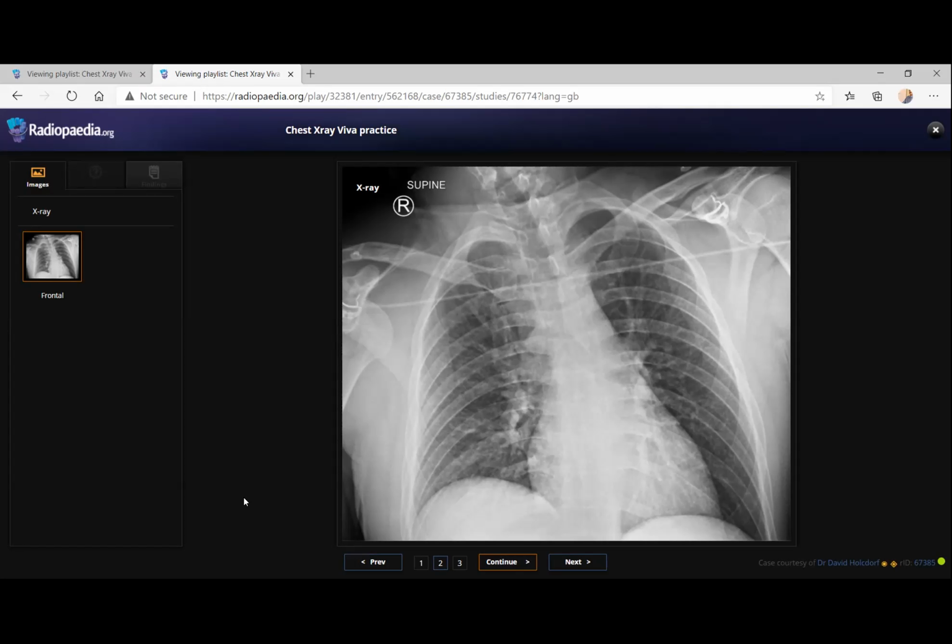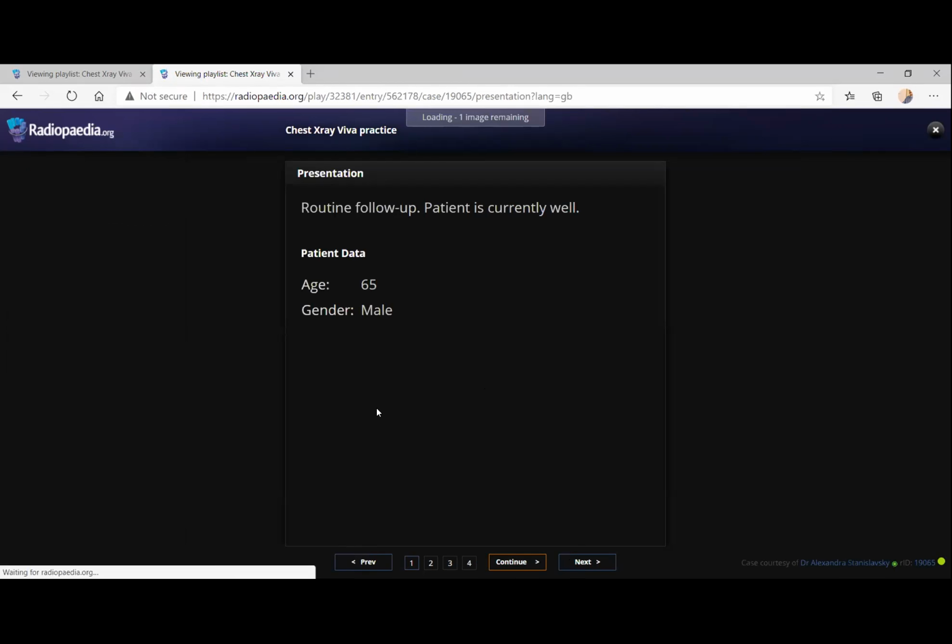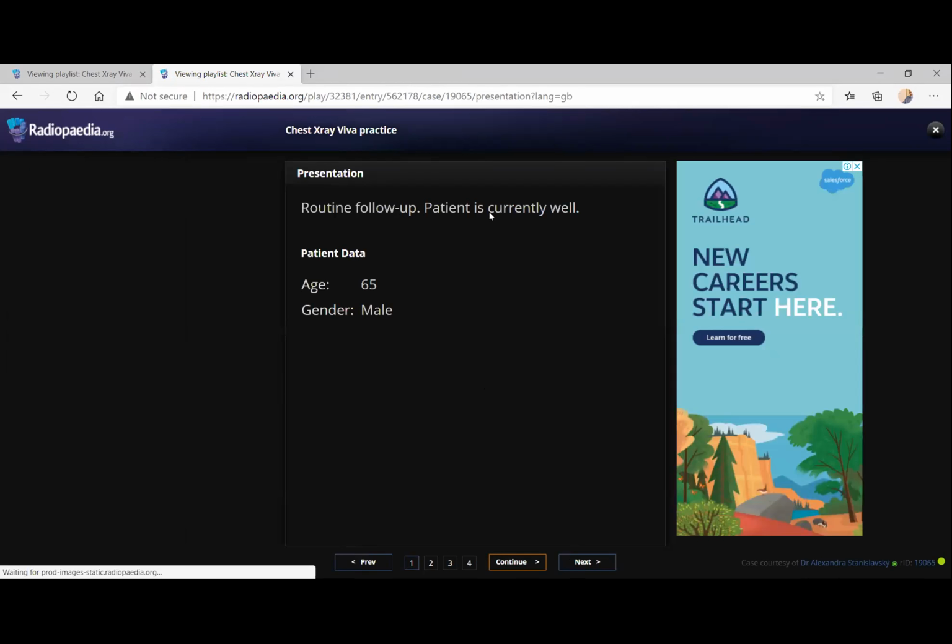I'm reviewing as well the bony structures. Yes, there is evidence of right shoulder joint dislocation. However, I'm not able to delineate any other. So what will you do? So I would refer this patient further to the orthopedic surgeon for further management of this dislocation. And you will not take a shoulder X-ray? Oh yes, I will. Of course, yes.